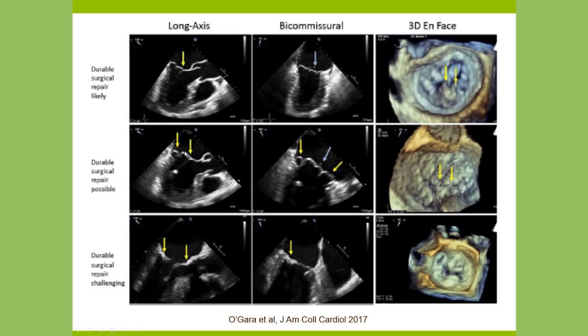This is possible. This is a bileaflet prolapse. You actually have some torn cords too. So you have all the scallops of the mitral leaflets are coming up. It's a Barlow's valve. You see that here. 2 torn cords shown here by the yellow arrows and multiple segments prolapsing. Many surgeons cannot repair this. They're going to replace it. But good mitral valve surgeons will always repair this. So this is really important to identify what's going on and get it into the hands of the right person.